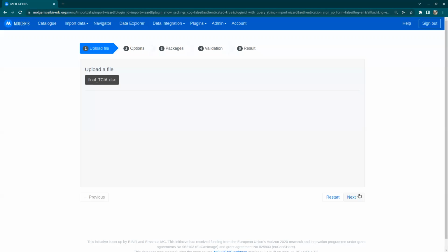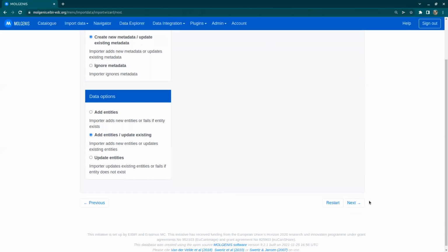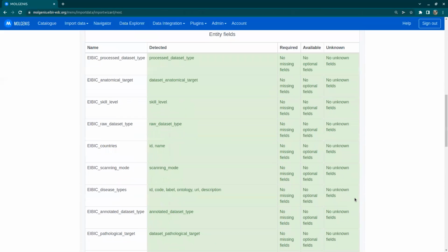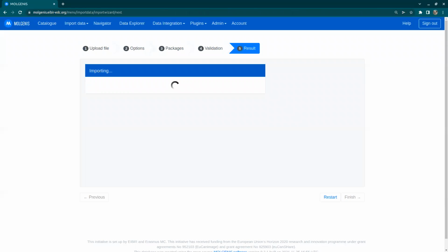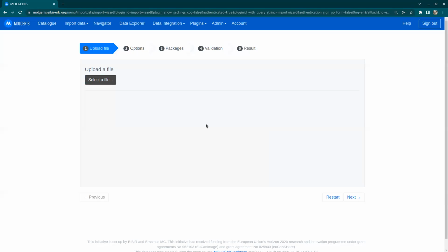yes. Next, we want to update, continue. And it looks like it was successful.